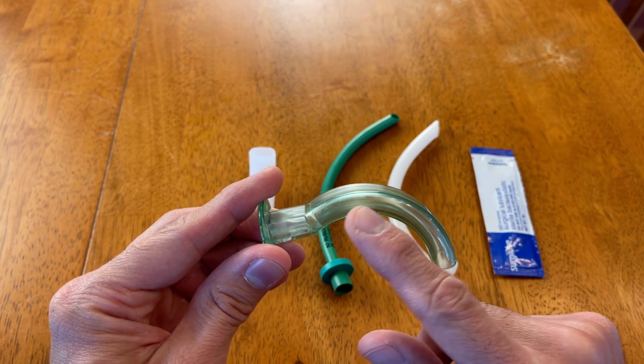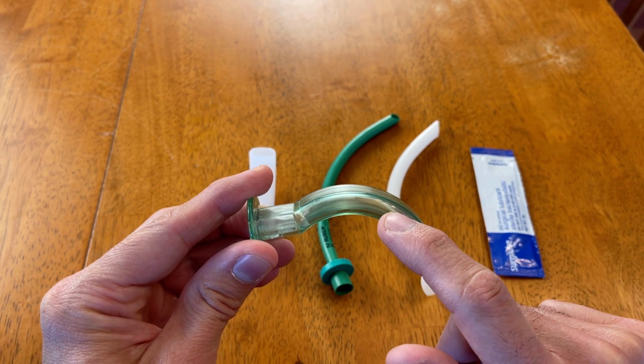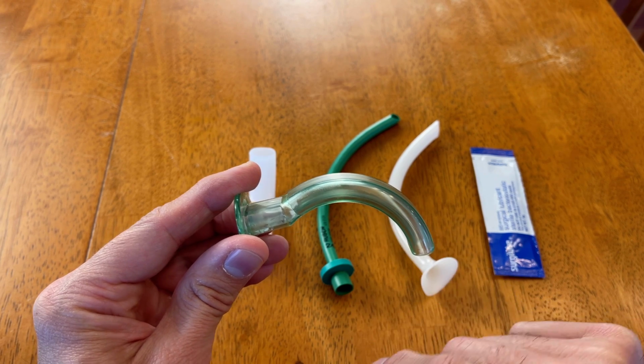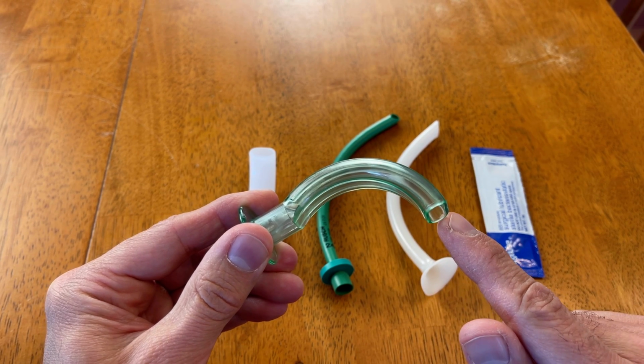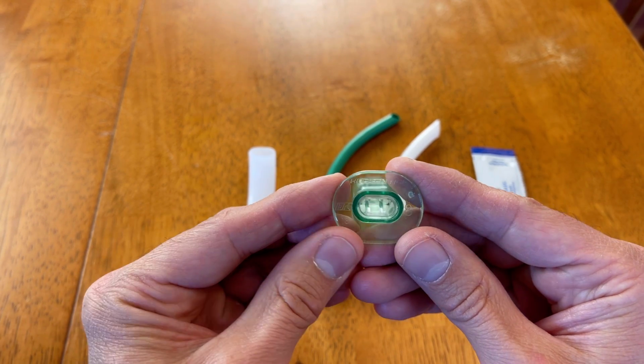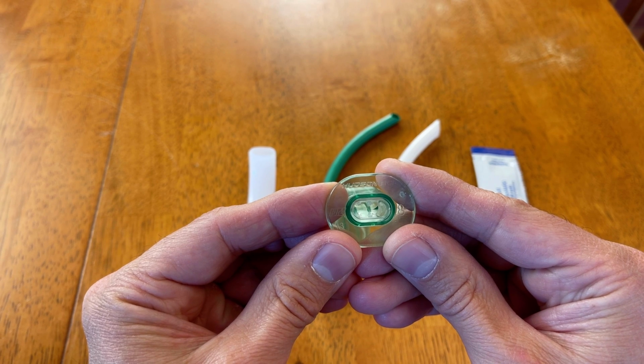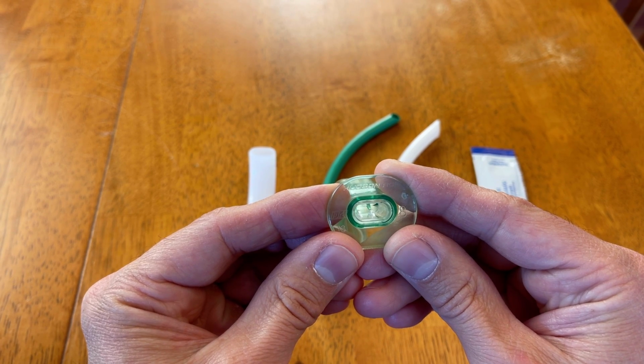The body, which is the contact surface, which I alluded to, you can kind of tell in its unique design and shape to displace that tongue forward. And then, of course, the distal tip. This is just the terminating portion of the OPA. And then, of course, there's a channel through the center through which the gas can pass through, and you can even suction through like the NPA.